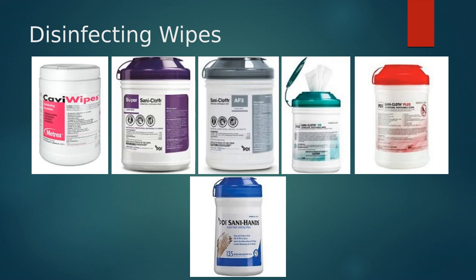The red top wipes, these typically will have bleach in them, I believe. We don't really use these on ultrasound machines because it can damage the transducer surface. The blue wipes, these are going to be the only wipes that are okay for patients to use on their skin. It's kind of just like a hand sanitizing wipe.